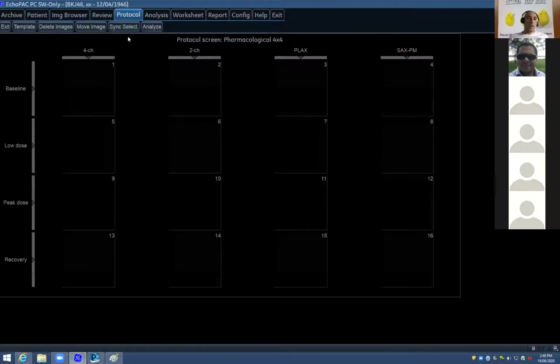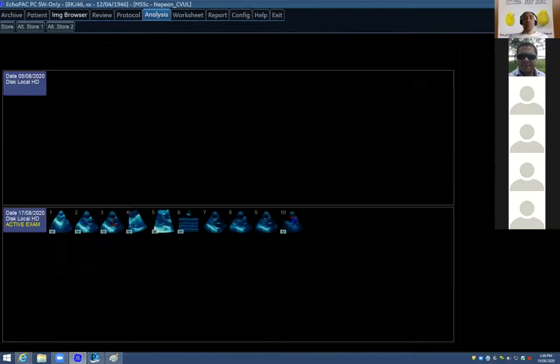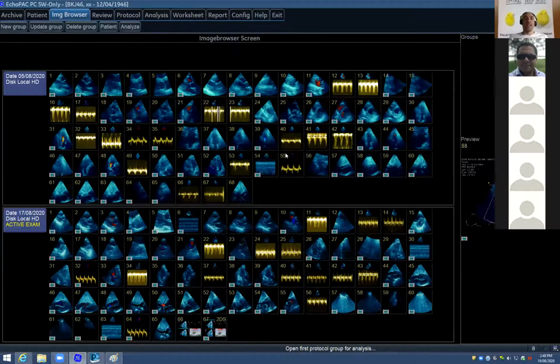Yeah, I'm just going to try and show you. Great, isn't it? Just that tiny little apical segment of the RV there is the only bit that's coming in. And I'd be interested to see what the RV strain looked like. Yeah, I haven't done that, I'm afraid. I'm just going to see if I can show you both next door to each other. Let's do that one, and let's do that one.